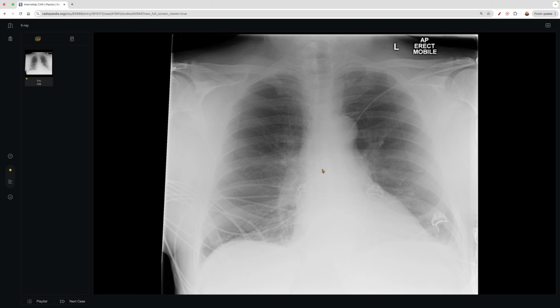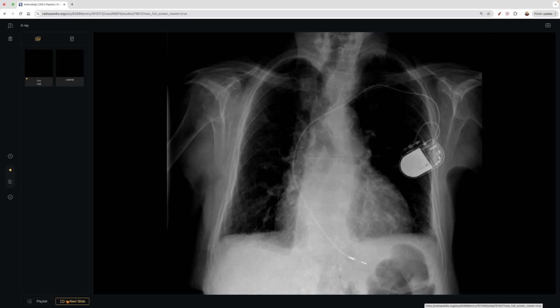We can't see the spine, and we know the spine has calcium, being bone, so we should be able to see it pretty distinguishable from the soft tissue of the heart, and we don't. And that's how you know, again, that the X-rays aren't going far enough or deep enough. So you compare that to this patient, and you say, wow, there's a night and day difference, right? These X-rays are going too hard, too far.